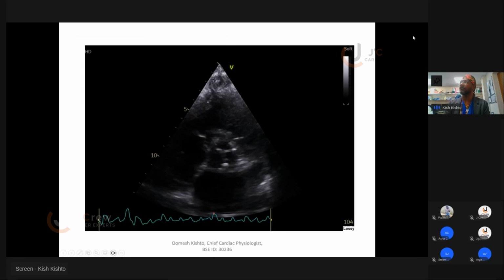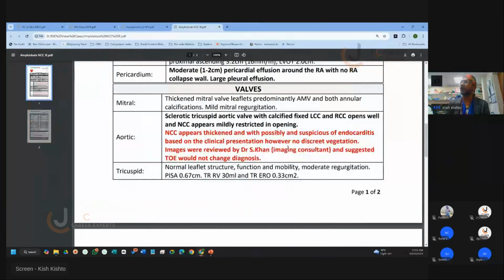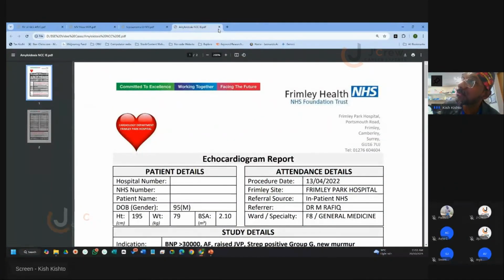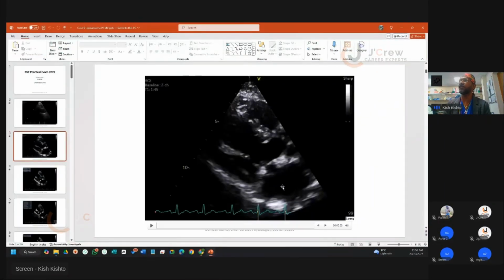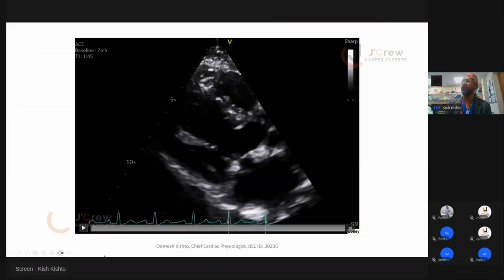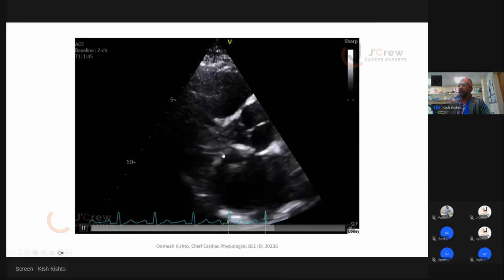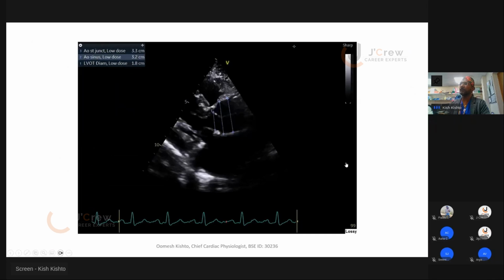That was our last image, like I said, that we've discussed already. Okay, let's close this. We will look at the image first, and then we look at the report. So this is my first image there. Measure as usual.